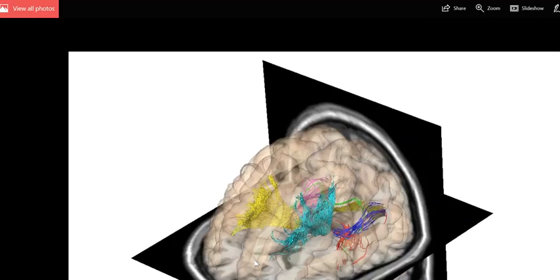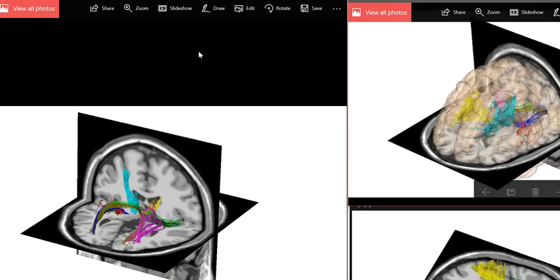This is another volume view of the diffusion tensor imaging. We'll be working on this so it'll be more clear than this, because we can control the depth of view, so your view is not blocked in the three-dimensional volume view. In any case, this is a work in progress. That will be our endpoint.